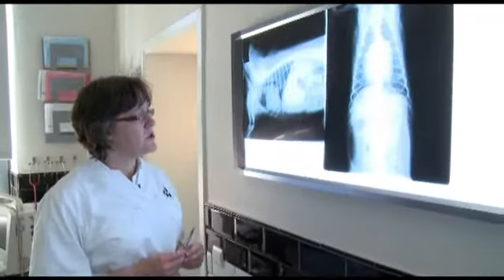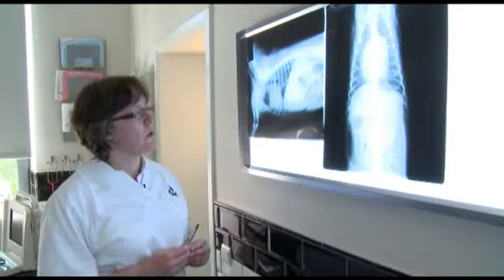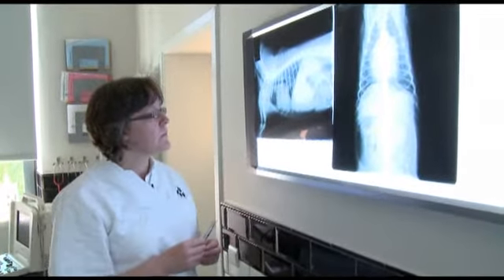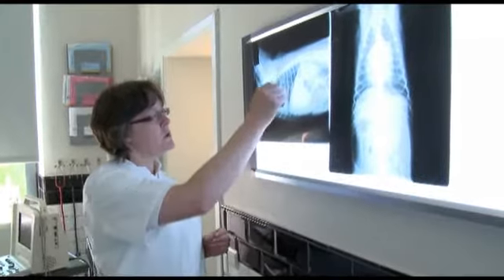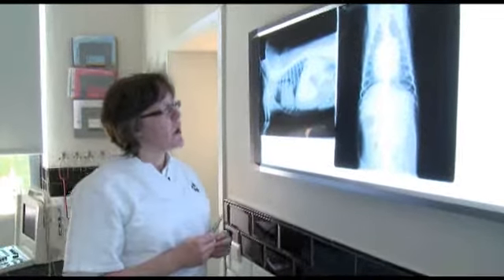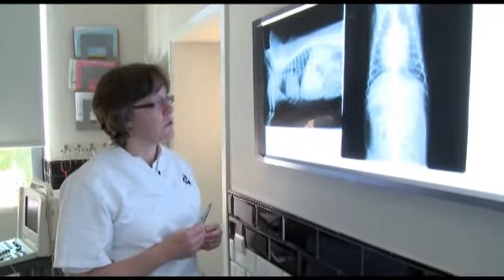Interstitial pulmonary patterns are characterized by a loss of vascular structure in the parenchyma, with a hazy honeycomb structure in the different lung lobes, and can be respiratory as well as cardiac in origin.